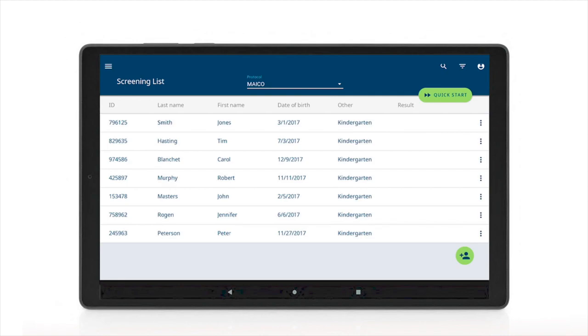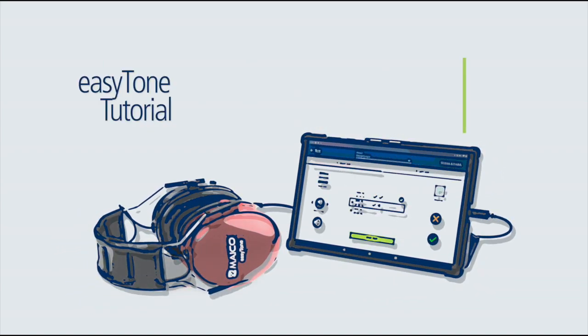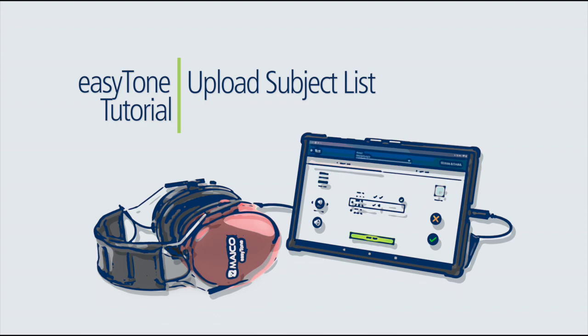This completes the tutorial on how to upload a subject list into the easyTone app. Please continue through the tutorial series for additional easyTone instruction.